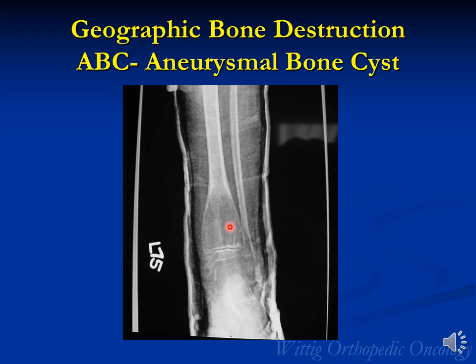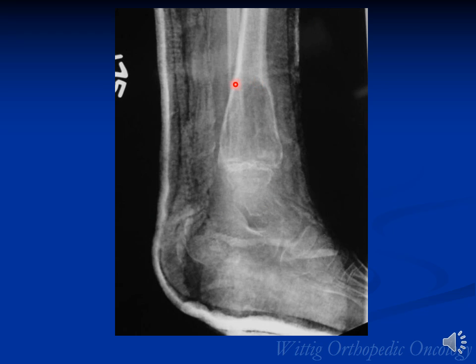What has really happened is the tumor has been growing inside the bone, gradually eroding the endosteal surface of the bone. While it's eroding the endosteal surface, the periosteum is laying down new bone on the outside, which gives us an expanded bony contour. This is the lateral, again showing the sharp zone of transition between the tumor and normal bone, indicating that this is benign.